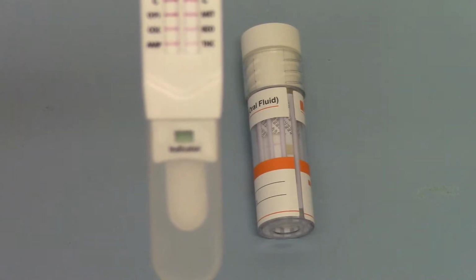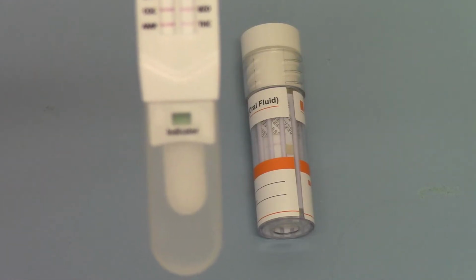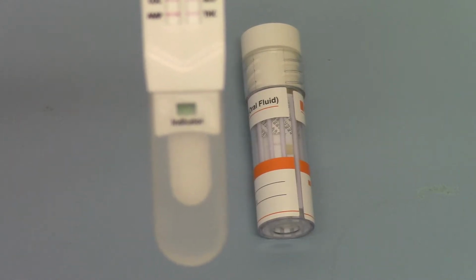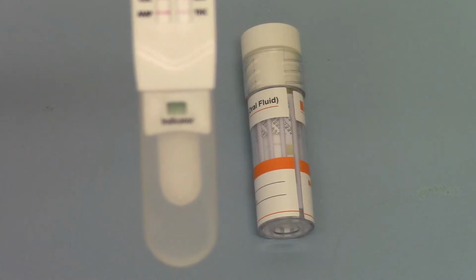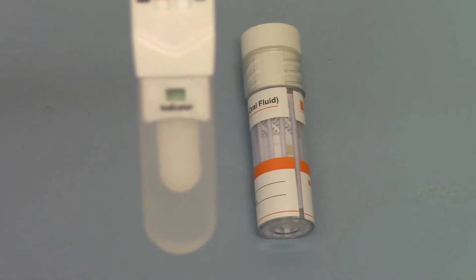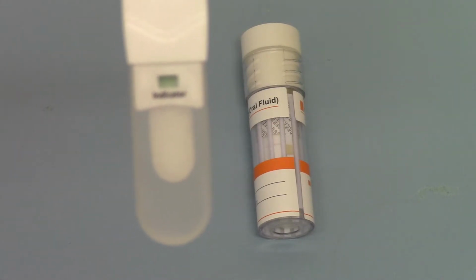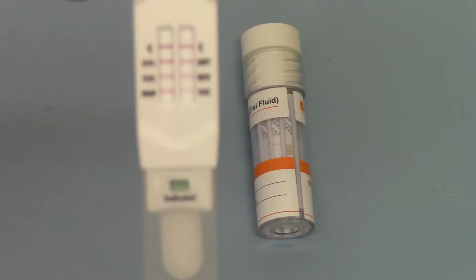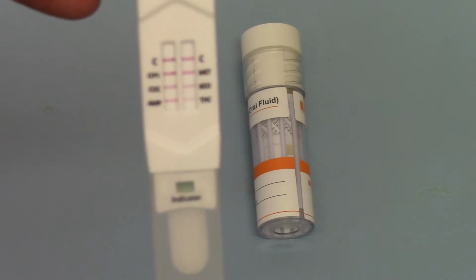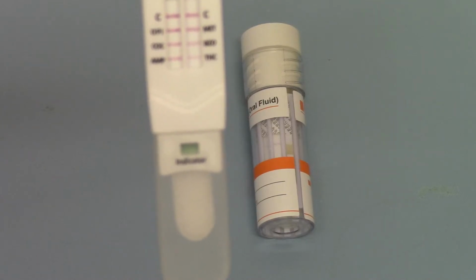But the difference in this is that the THC membrane there is screening for 12 nanograms of THC, which is a very different dynamic test antigenic material to the BZO and MET above, which are screening at higher levels. So there is always going to be this variation between the THC and the BZO and the MET and any other membrane on there, and that is going to be more or less consistent across a series of tests that you do with this. You will notice, even if you were to do a couple of successive tests with this particular membrane, there may be some variation between samples that were just collected a couple of minutes apart.